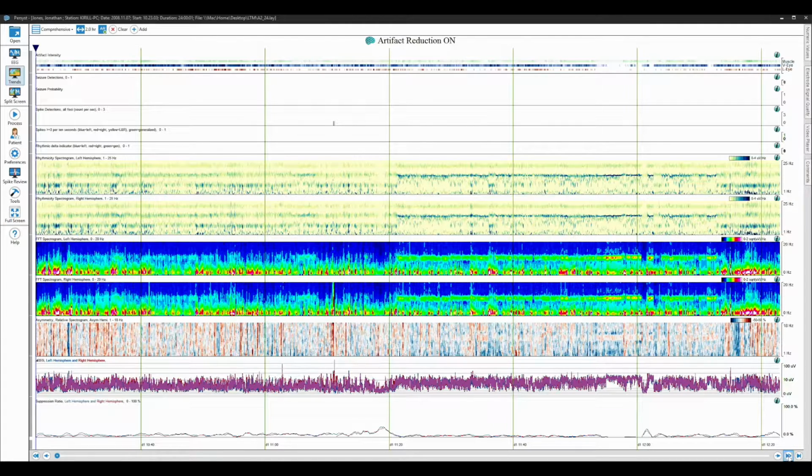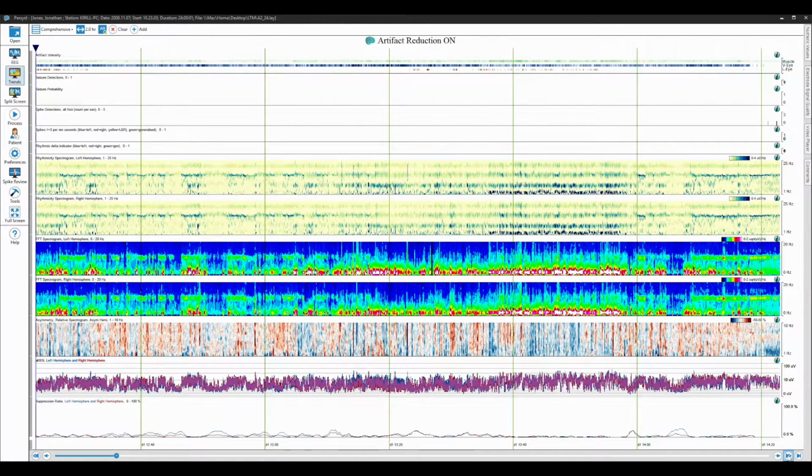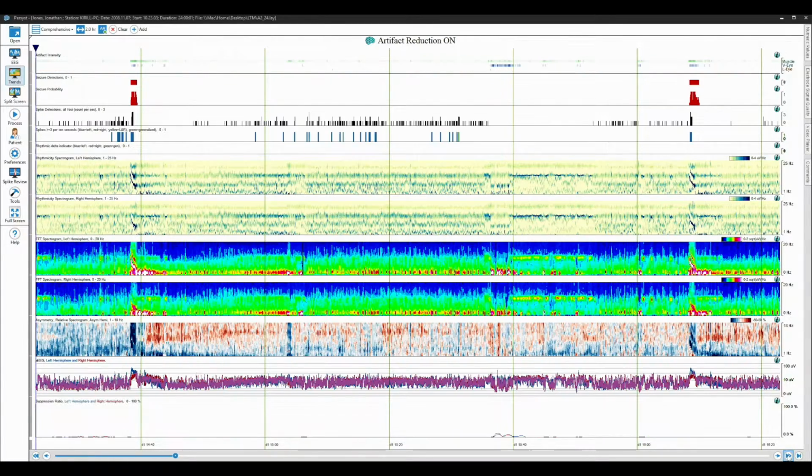What I'm going to do now is move forward using this button on the bottom right. I'll be moving forward 2 hours at a time. And that shows how quickly I can review this kind of record. So I've just moved forward 2 hours. And still nothing is happening. The patient is still awake, as you can see at the top of the screen. I move forward another 2 hours, and now some things start to happen.